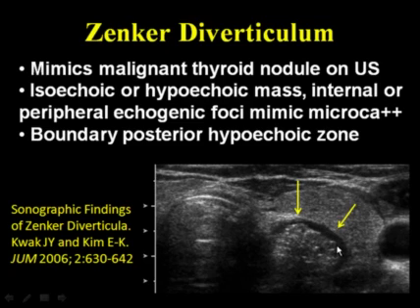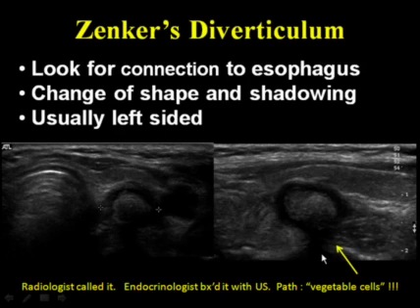And one of the hallmarks is that it might change. If you don't catch this and you're worried that it's a thyroid lesion and you send it back for biopsy, if you look at the prior study when the patient comes for the biopsy, usually these lesions look quite different between 2 different studies.